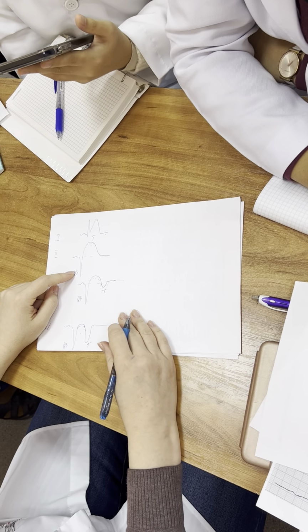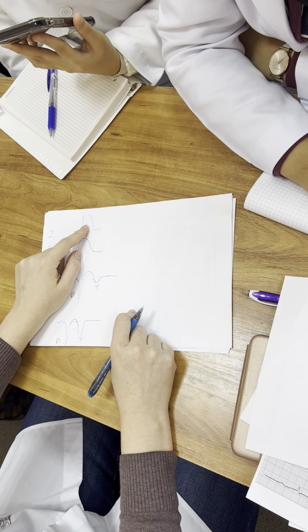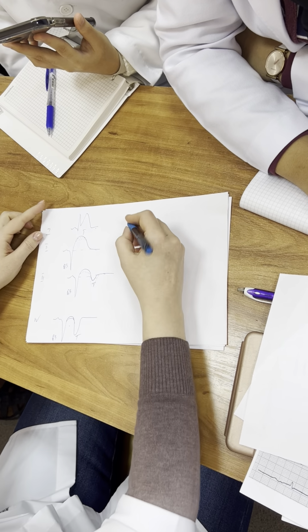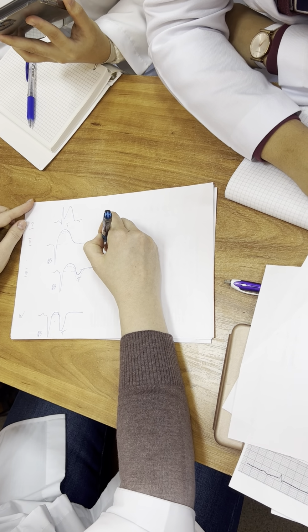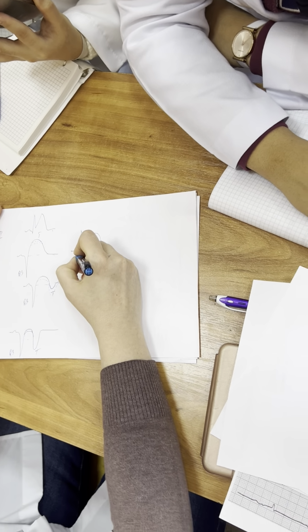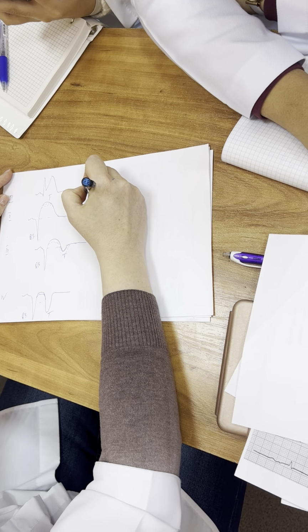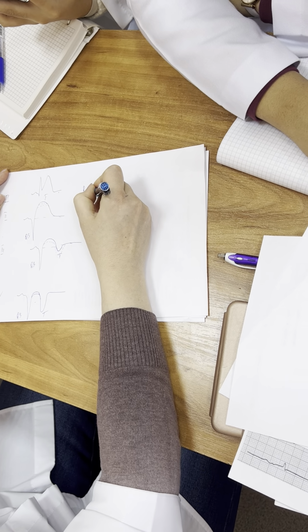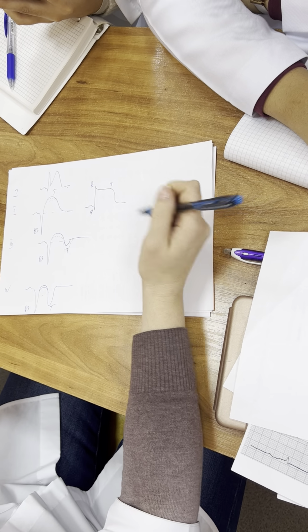It's transmural MI, QMI. The same acute stage, the same picture. But in acute stage, what changes will it be? Q normal yet, R normal yet. ST elevated and positive T. This gets back, you see?